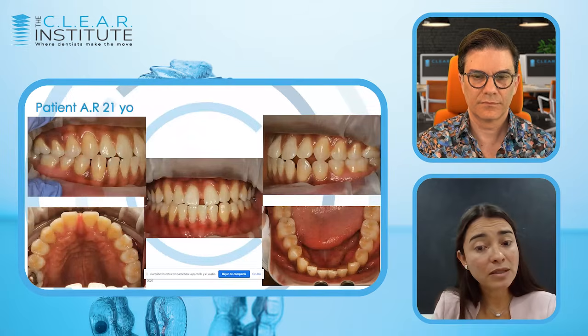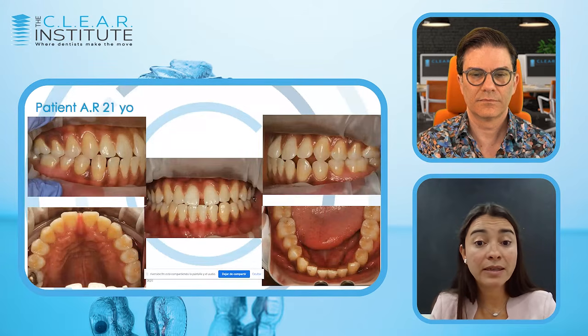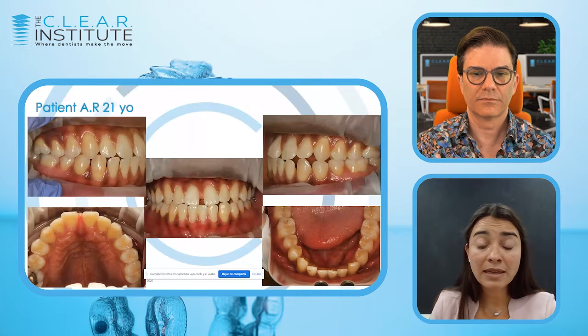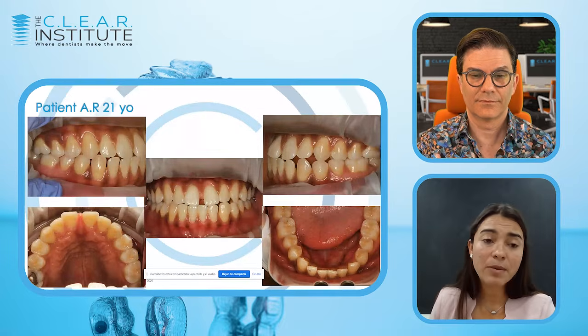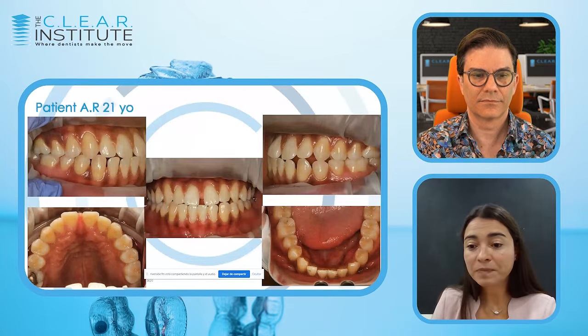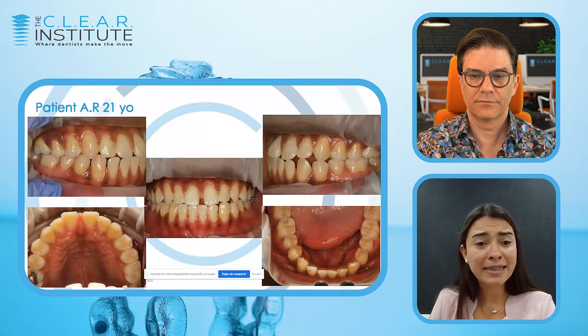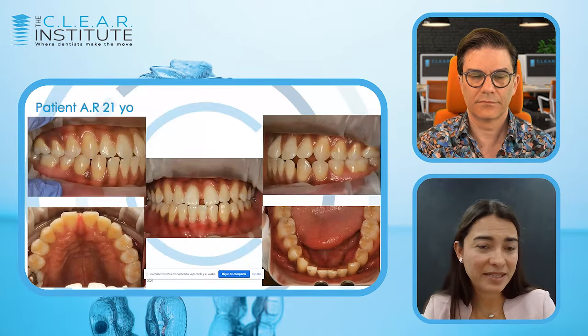But when patients with these characteristics do want to close their diastemas, we need to note that the soft tissue component is strong. A very deep frenectomy will be required, and fixed retention will be required as well, because there's going to be a tendency to keep opening, because it's part of the natural way that Afro-American teeth and maxillary bones are configured. So that's another thing we see here. We see a little bit of spacing in the lower arch as well. And now we are ready to start making some decisions.